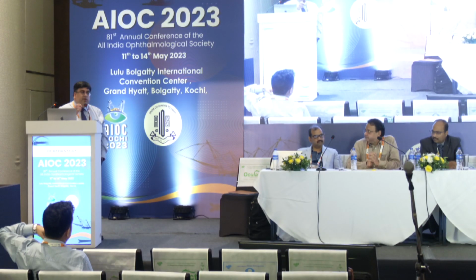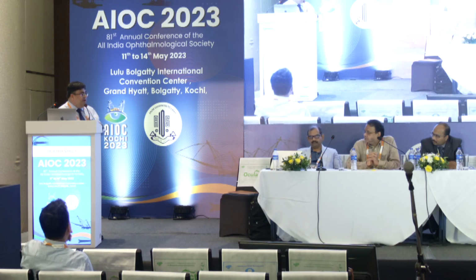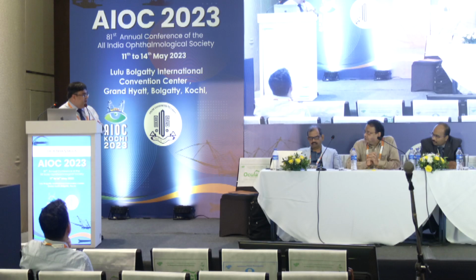I'll tell you, when I'm looking at a diabetic or a vascular disease, my intent is to look at the montage, and I prefer using the Zeiss Plex Elite or the Cirrus 6000, 5000, which gives me a large montage and allows me to go wider in my field of view. But when I'm looking at depth of the disease, when I'm looking at choroidal neovascular networks, my preferred choice is the Topcon system. Topcon gives me a beautiful swept source image from the deeper tissues.